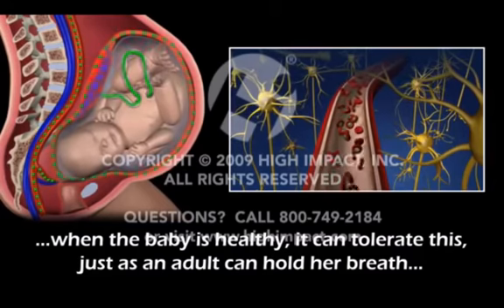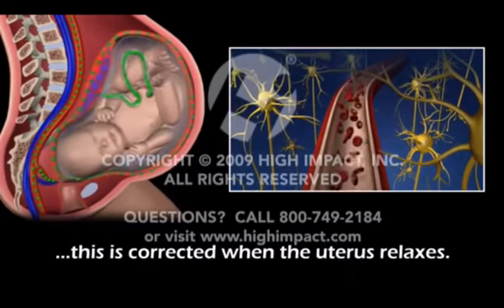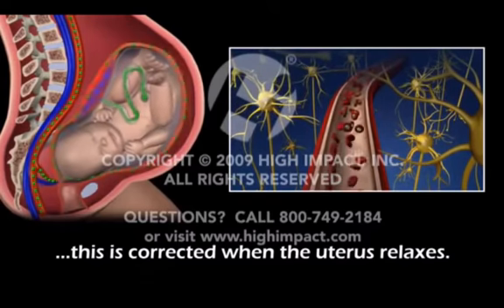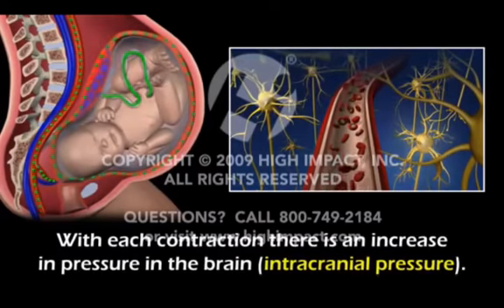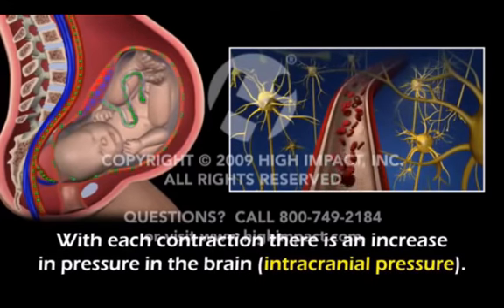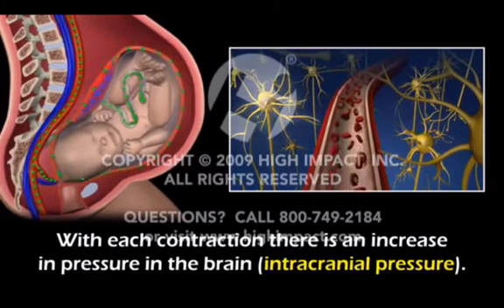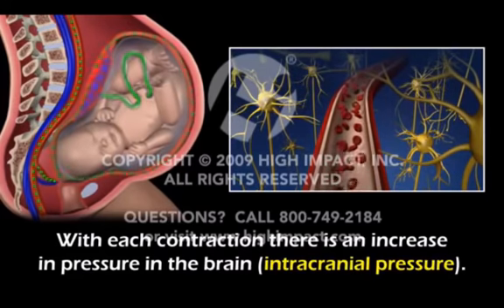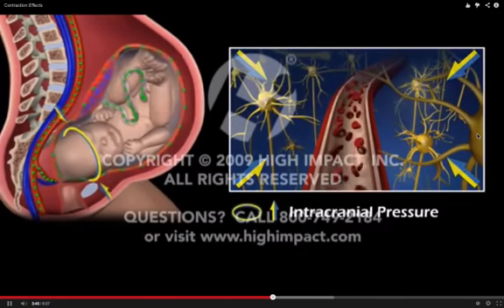So we know that if you have a normal, healthy adult, they can hold their breath for long periods of time, as long as they get a break in between, and that's true of a baby as well. We want a healthy baby to have a contraction and a break, a contraction and a break. This baby will be okay as long as it gets regular breaks in between contractions.